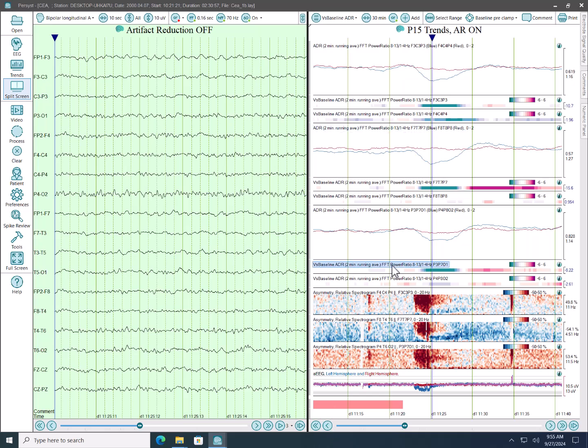So we can get z-score statistical metrics for spectrograms, but we can also get them for single line trends. So if the question is, okay, I've had a drop or change, an increase or a decrease in these ratio trends, statistically, what was that change? How many z-scores am I from that empirical null that was calculated? You get it right there.